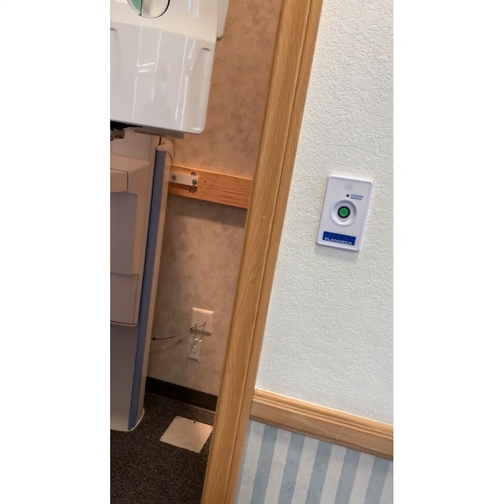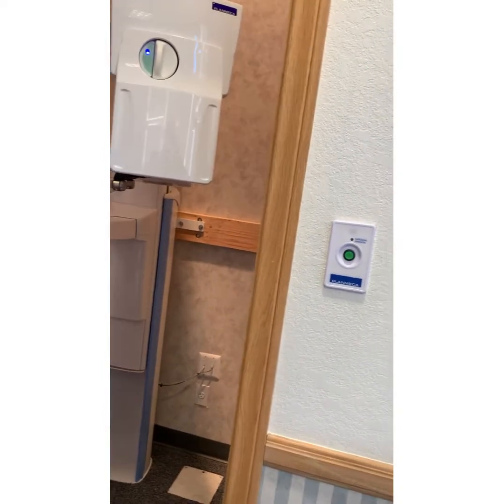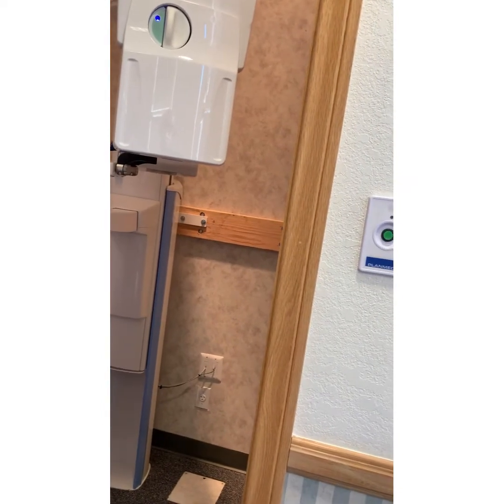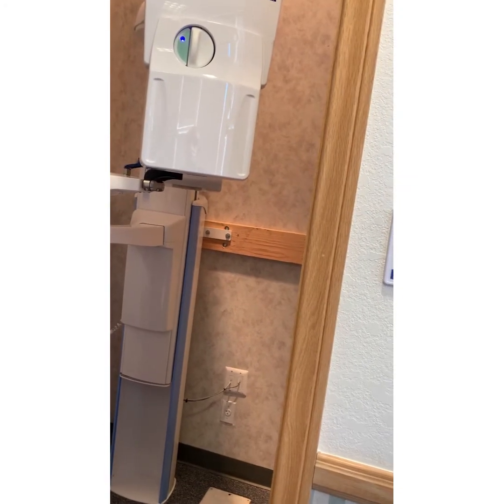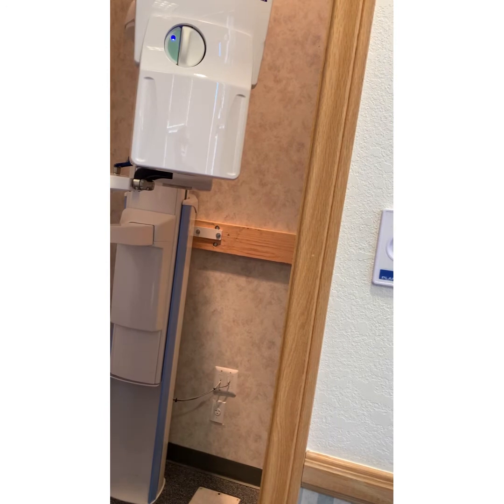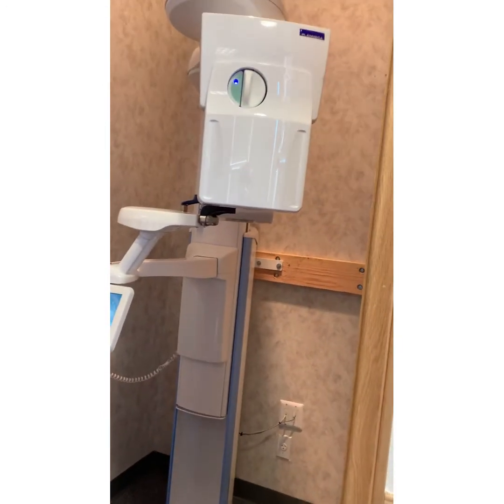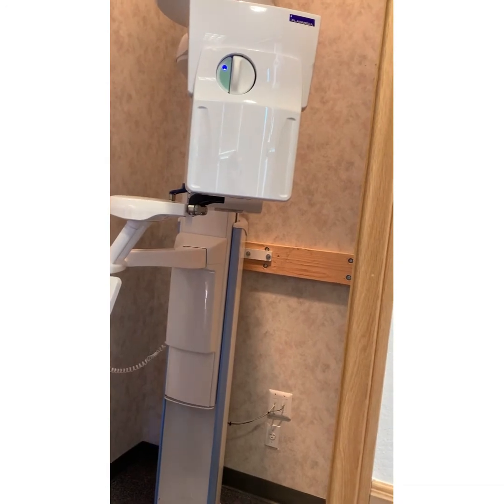Trust me, I've seen a lot of different installations where it's in a hallway and you can't even get around the unit to set it up. There were limitations as to what they could do, and I see that this is a fixable thing here. I'm going to make mention of this when I leave. Great, thank you. That's great. Of course.